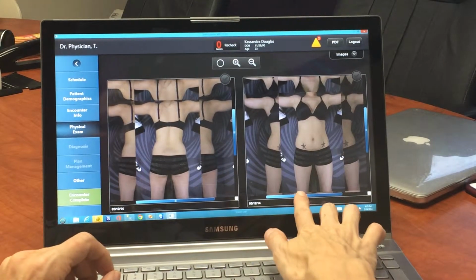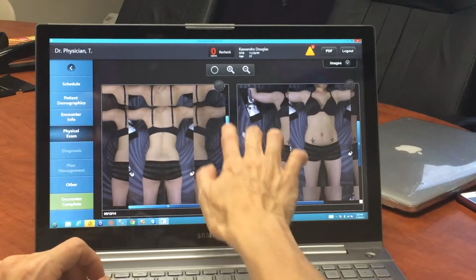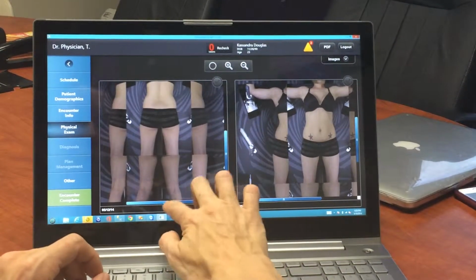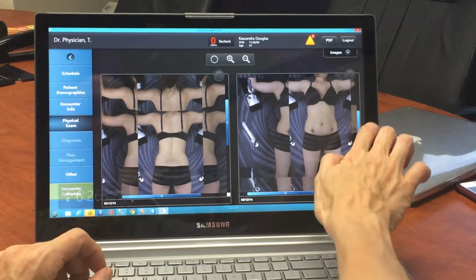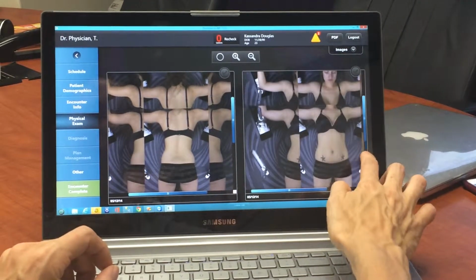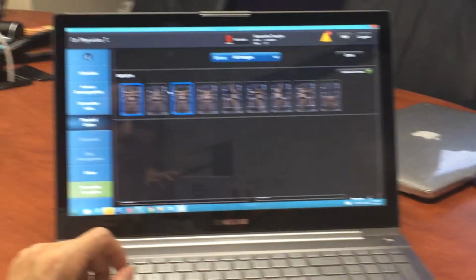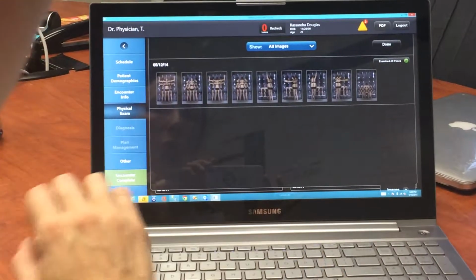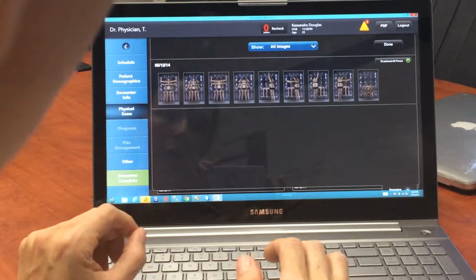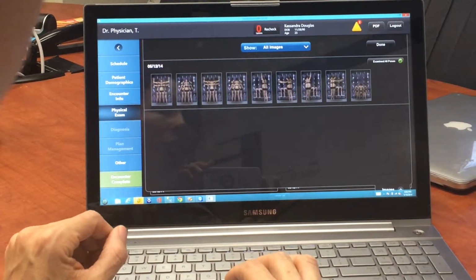You can also use your lower bars or your side bars if you want to navigate using this feature. So you again can do it through your fingers in the image, or you can use your bars for navigation. Go back to all images again, and then you can deselect. This basically concludes the aspect of the video that has to do with image navigation, and then we'll be moving on into image annotation.